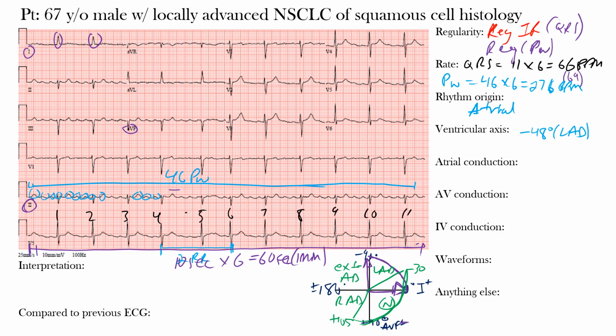Now we have to determine where within this area we actually are, okay? Remember, we're somewhere within this area, but we have to see if we're in this normal region here or are we in that leftward axis deviation, okay? So let's look at this.